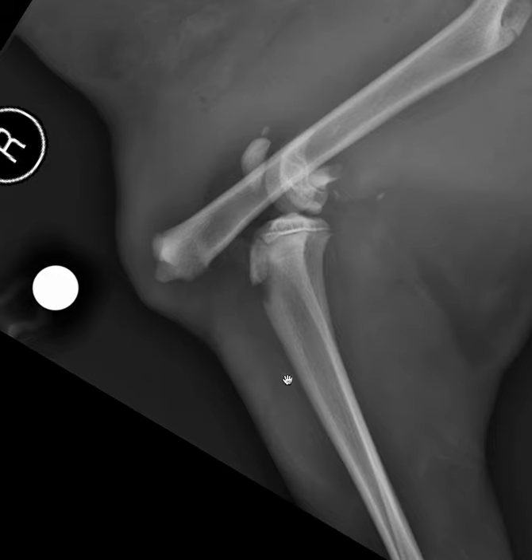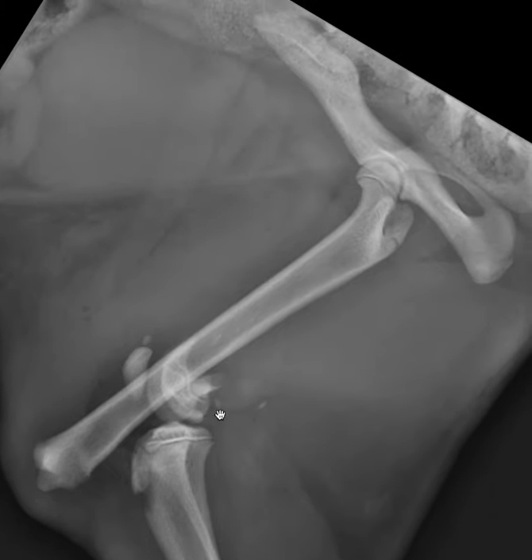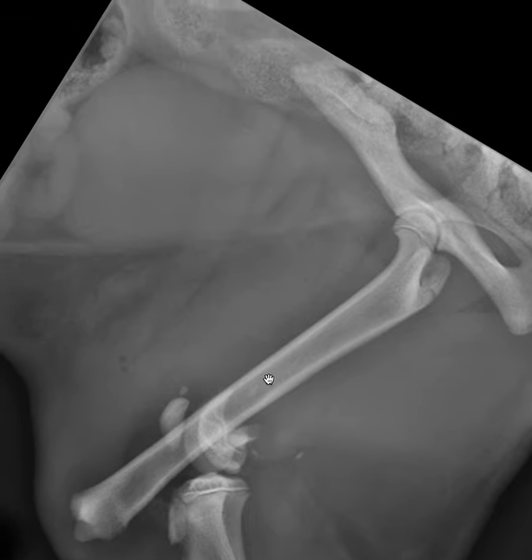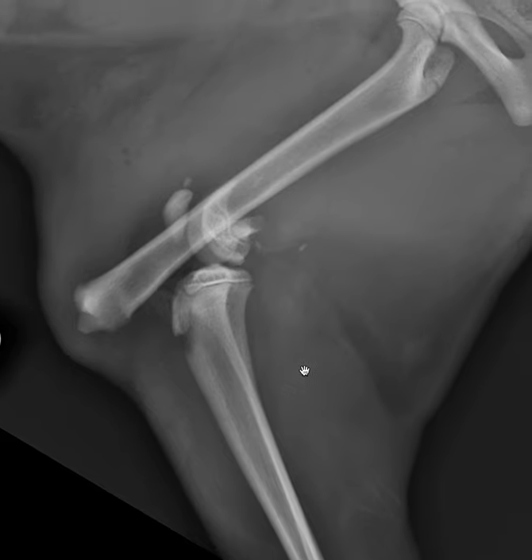It's really important, when we have a dramatic lesion like this, to not stop once we've composed our beautiful fracture sentence. You want to continue to practice the ABCDs on the rest of the images. Remember, when you're imaging animals that have had potential trauma, you're always going to catch a little bit of the abdomen, for example, when you look at the pelvis. So you want to make sure that you assess the bladder. Any concurrent injury that the animal may have could definitely affect your treatment plan as well as the prognosis.